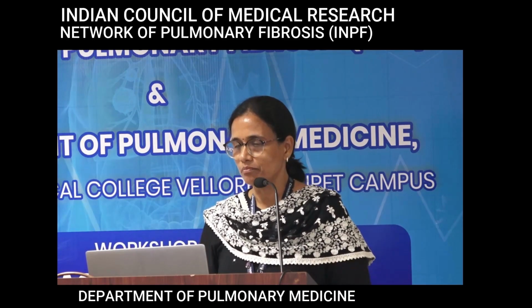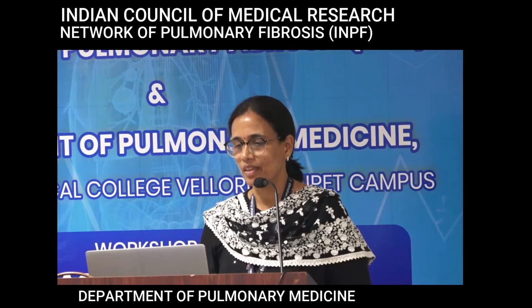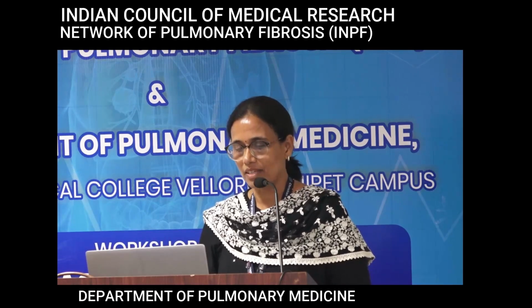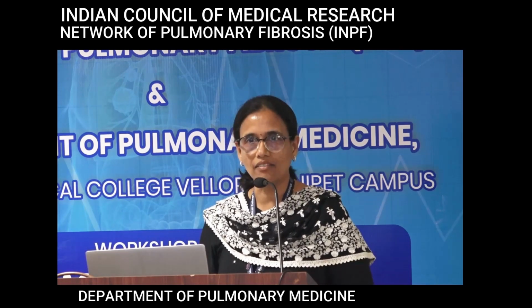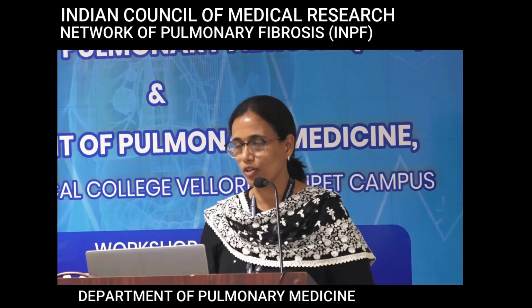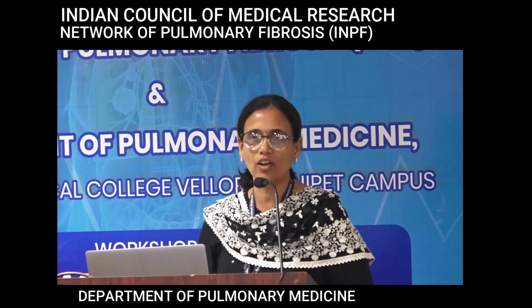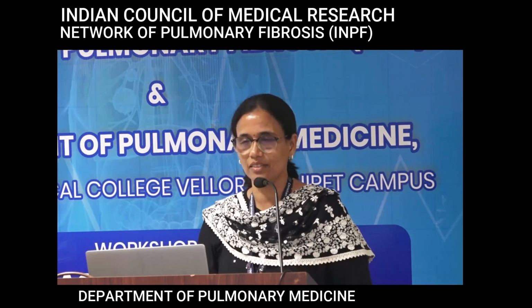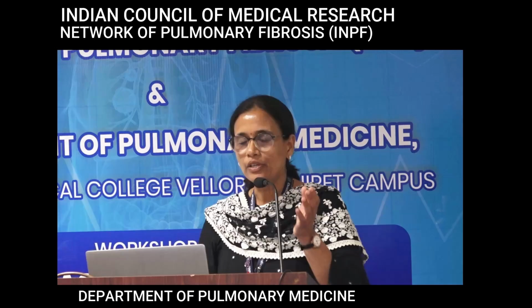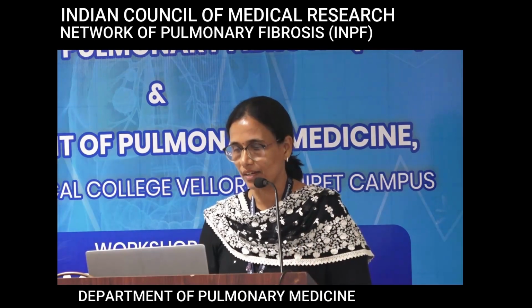What do you think this patient is having? This is Hermansky-Pudlak syndrome. How are we saying that? He had UIP on his CT, and he also had oculocutaneous albinism, which I've just masked. The combination together is Hermansky-Pudlak syndrome. So UIP pattern can be seen in many conditions.